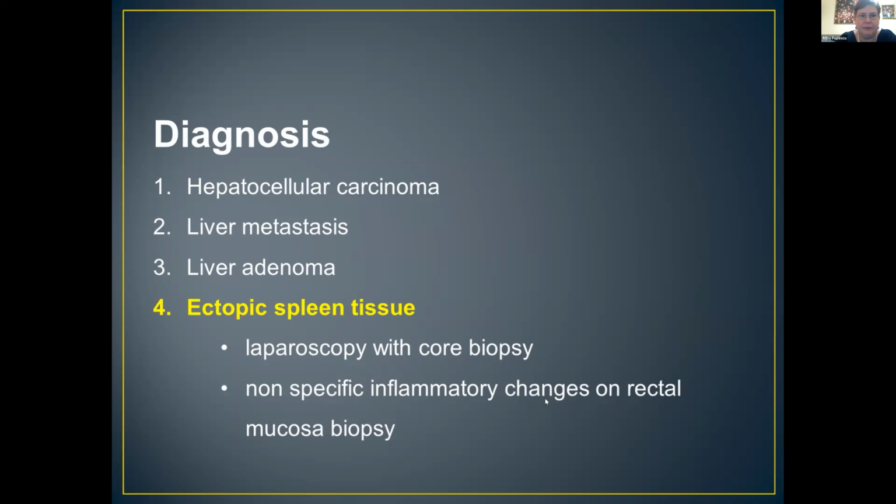Can I comment a little bit? Yes. I wonder if you had performed also a CT, because in CT the spleen has in arterial phase zebra enhancement. It's a typical enhancement of the splenic tissue that is quite pathognomonic. It's not found in all ectopic splenic tissue. We can find a homogeneous enhancement and not especially zebra pattern. Okay, very interesting case.